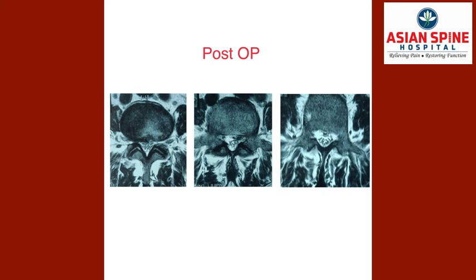This is the immediate post-op image where you can see the fragment is completely removed and the facet is not violated. Just a bit of the superior facet is drilled and the complete fragment has come out.